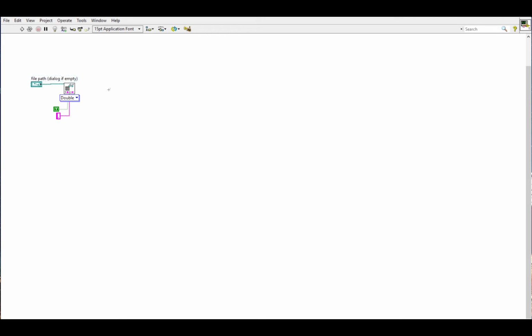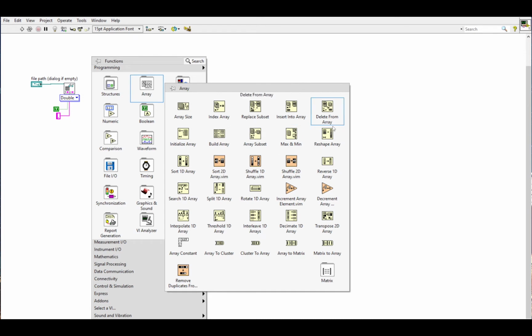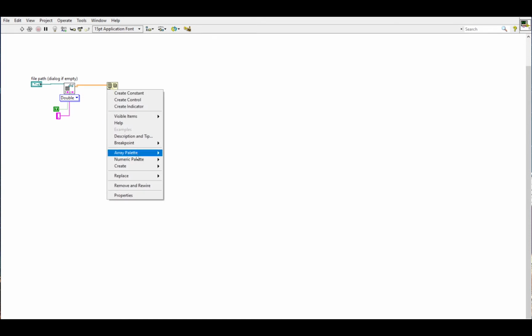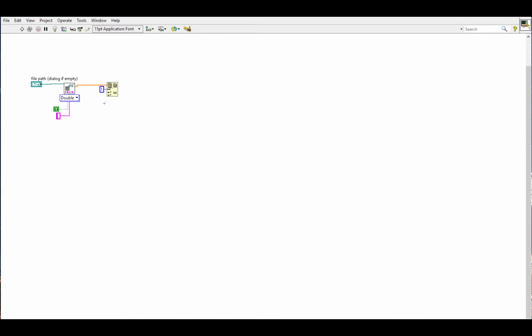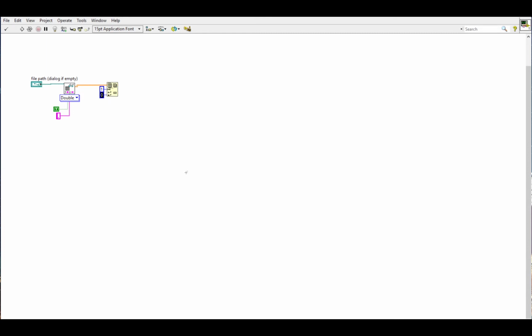Next, let's remove the first column of data since we know that this is going to be our heading labels. So we'll remove one column of data. So length of 1, index of 0 in the column index.